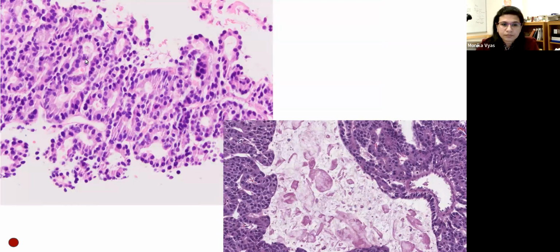When they're present in a tissue specimen like this with back-to-back arrangement and obvious atypia, it's less of a diagnostic challenge, and in fact a good clue that this may be an acinar cell carcinoma. But oftentimes when atypia is not significant, it could be a challenge to diagnose these. And then you can also have trabecular architecture, as you can see in the image on the lower right. And oftentimes you can see these secretions, which are eosinophilic concretions present within the lumina of the glands.